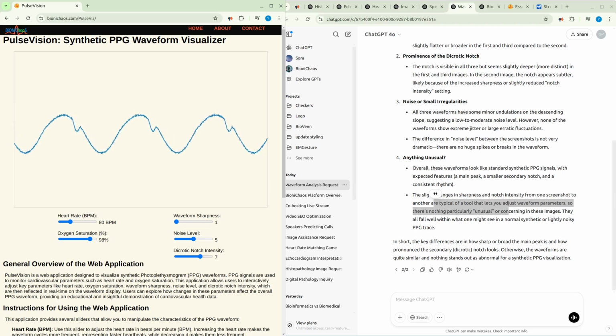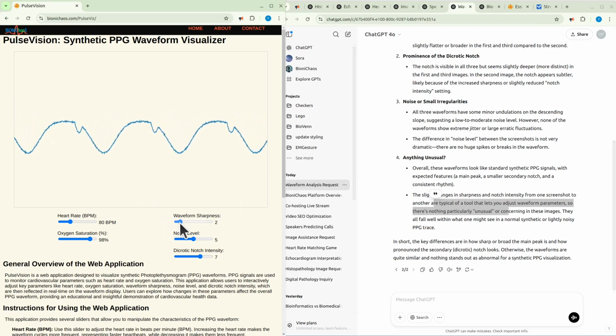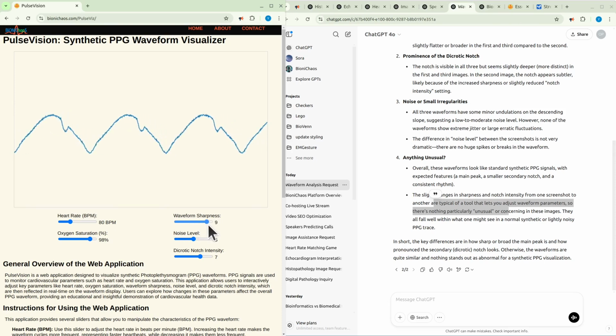It's actually, now that I'm looking at it, okay between 1 and 2. Yeah, there's something weird happening.